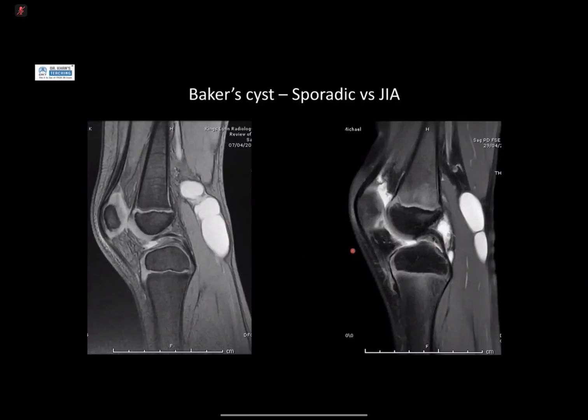And 2 different patients. You can see that on this one, you've got synovial thickening, and synovium on MR on T2 is these low signal frond-like bits that coat the joint capsule, the joint space, and that's basically an inflammatory process driving this Baker cyst production, versus one that has mostly joint fluid within the Baker cyst, but none really in the joint space, and no evidence of synovitis. So I think this is just to let you know that if you do have a Baker cyst, although it's reported, just make sure that there's nothing else underlying that's driving it.